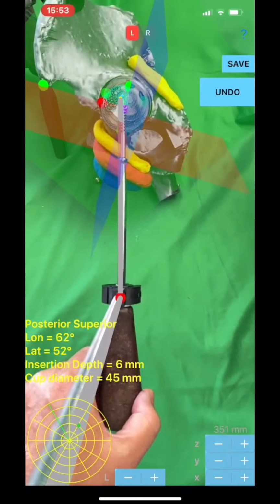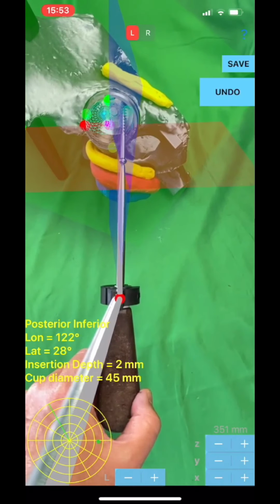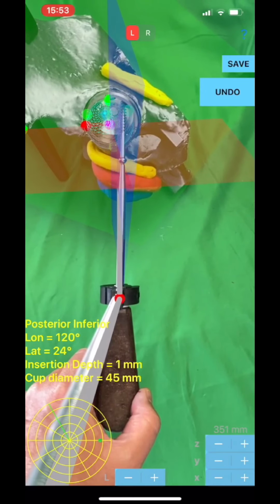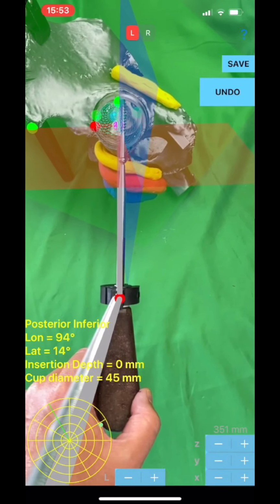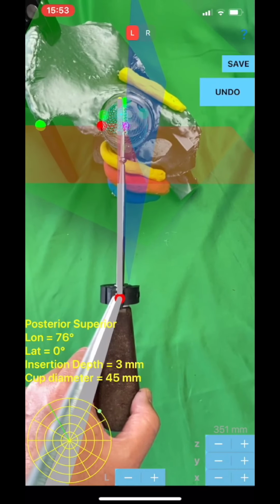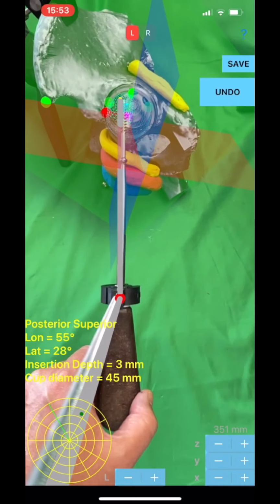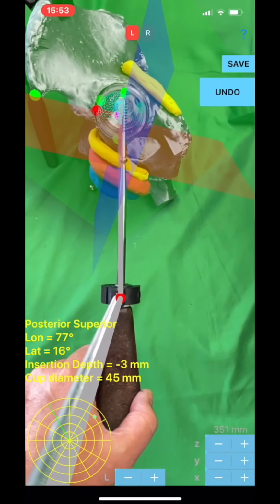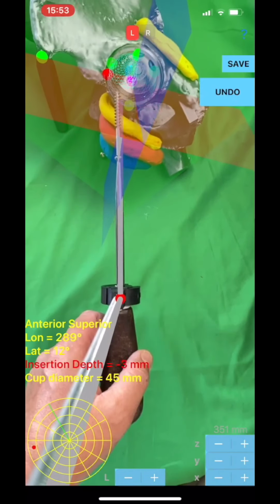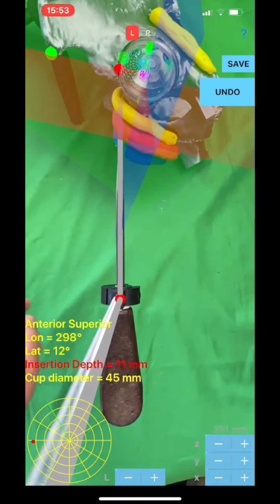A 2D topographical map according to the 3D depth of the cup is depicted and acts as a radar navigation map during screw placement. A 2D dartboard-like drawing, composed of concentric circles, latitude, divided by lines, longitude, reflects the corresponding 3D depth cup hemisphere. Radar screen: a green line in the radar screen reflects the projected location of the anterior superior iliac spine ASIS, where the longitude value is set to 0 degrees, and the increase in degrees towards 360 degrees is counterclockwise or clockwise according to L or R measurement.